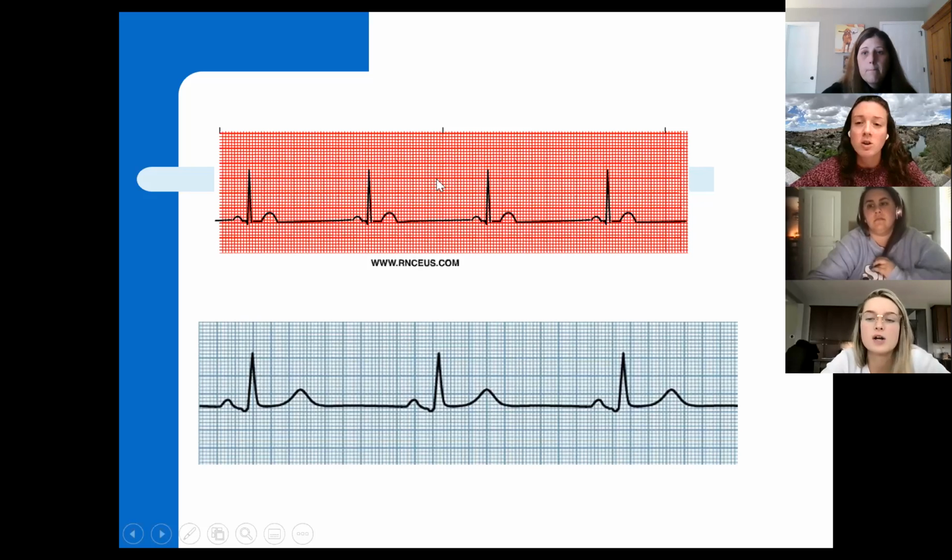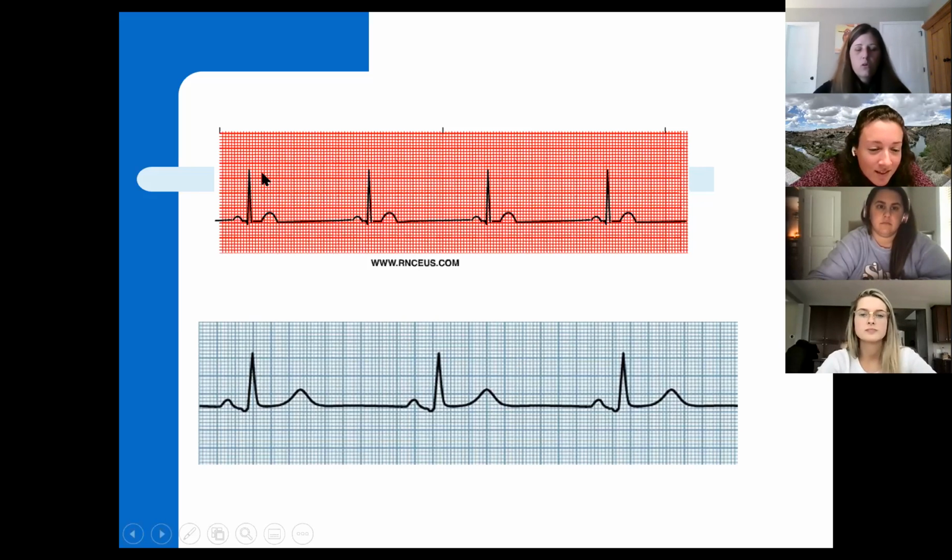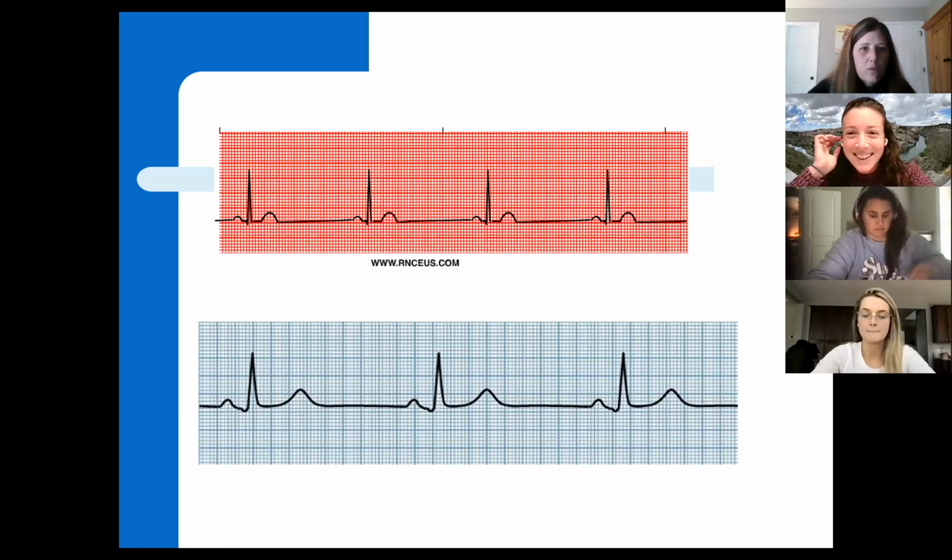I think you forgot the 100 between. Oh, did I? 150, 75. Oh, for heaven's sakes! Thank you, thank you. See, I get talking and I get excited and I didn't even say it. Okay, I'm going cross-eyed here. Can y'all see my mouse moving though with it?